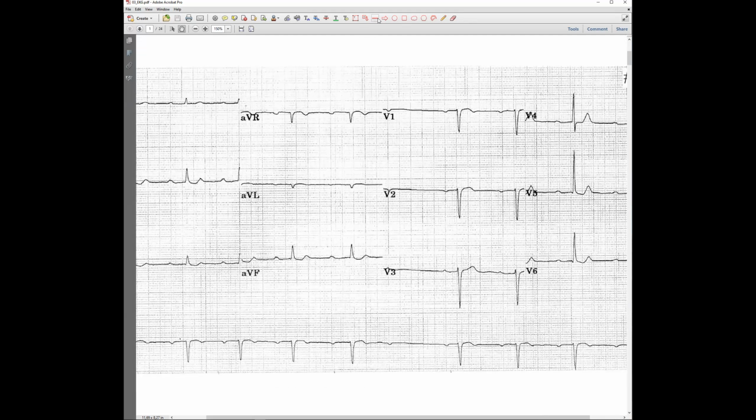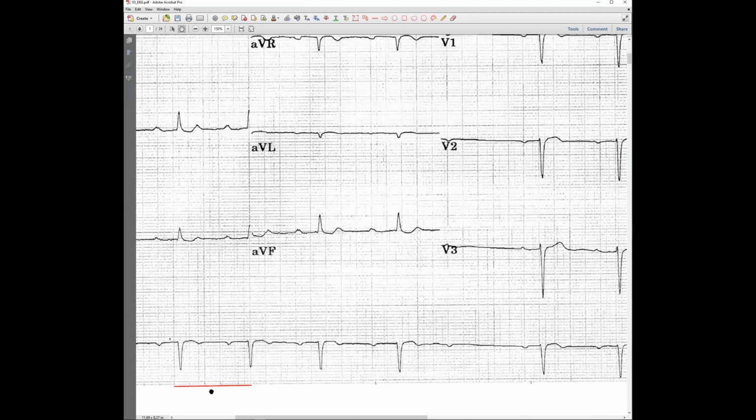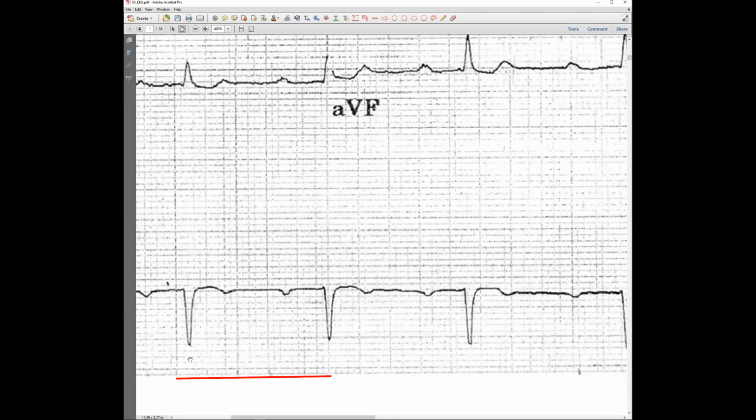Now, the best one, if you choose, for example, this, how many squares do we have to have? We have to have at least 5 squares. 2, 3, 4. I think that's about 5. I have to check whether we do have 5 or not. 1, 2, 3, 4, barely 5.